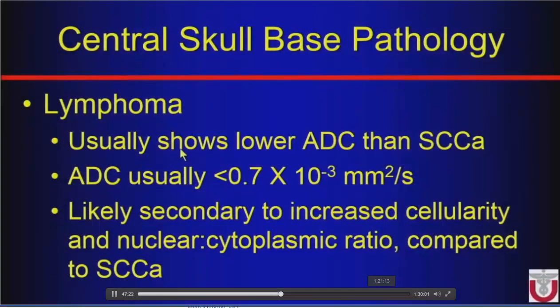Lymphoma, interestingly, is one of those things that has very low ADC values. It's one of those hypercellular things. So it may have ADC values that are even lower than squamous cell carcinoma, can be lower than 0.7.